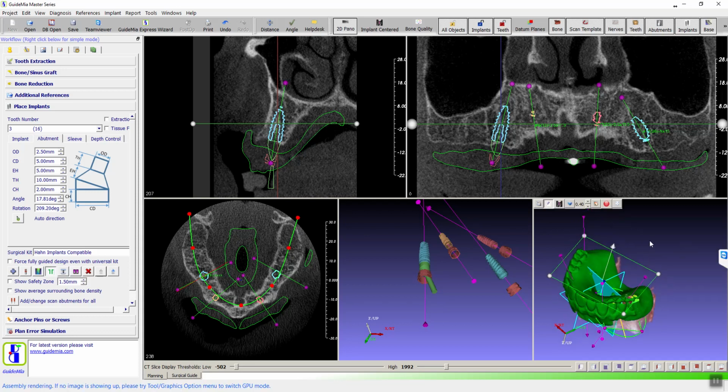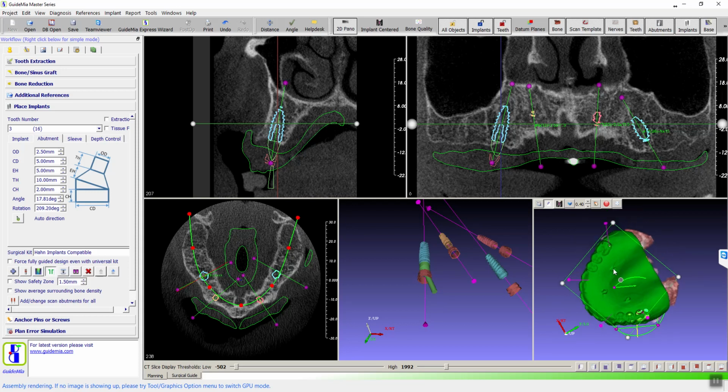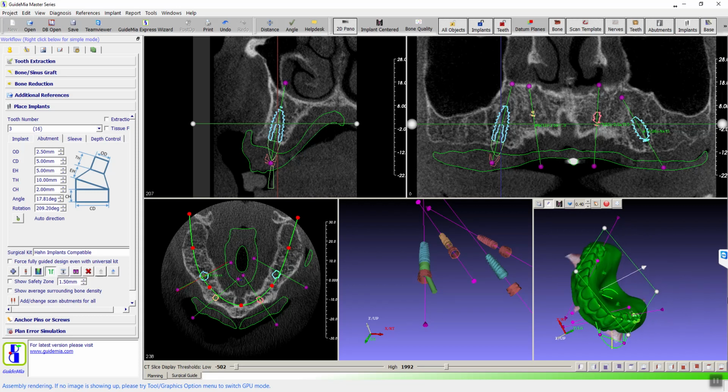You can use either one of those. We use this plane to determine occlusion orientation so that when we rotate to the screen direction, we know the occlusion orientation is perpendicular to the screen. So that's all you're using it for. Yeah, I use that to determine the orientation.